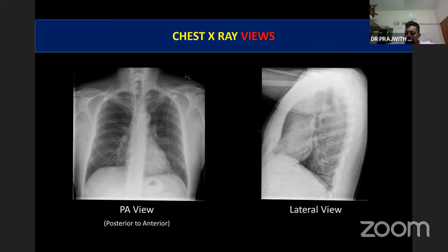So, after holding the hand on the waist and folding the elbows anteriorly, we are moving the scapula outwards. We get an open space. That's why we are seeing most of the scapula outside the lung field. Most of the scapula is outside. If it is a PA view, I usually don't want the scapula inside. Why don't I want the scapula inside?